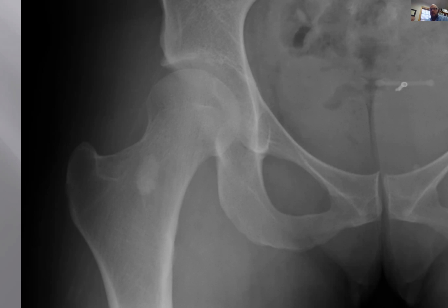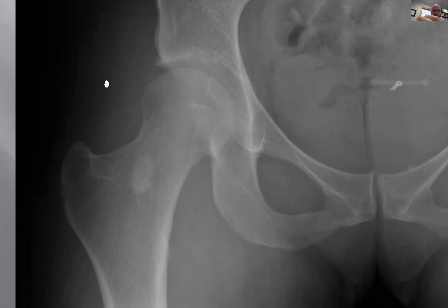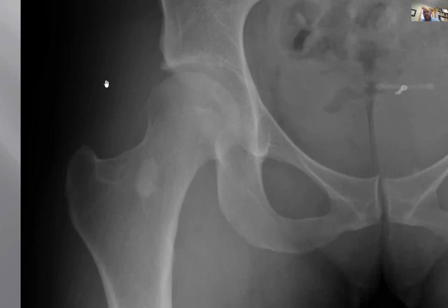When you see periosteal reaction, like Codman's triangle or onion skin, we used to learn all those terms. The reason that is so important is that it's evidence of cortical breakthrough. Of course, if you have a large soft tissue mass out laterally or something on this case, then that would be evidence of cortical breakthrough as well. Good. So we're going non-aggressive here.